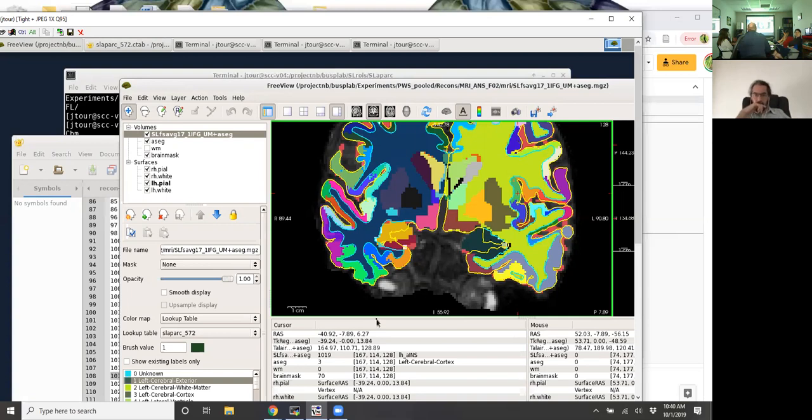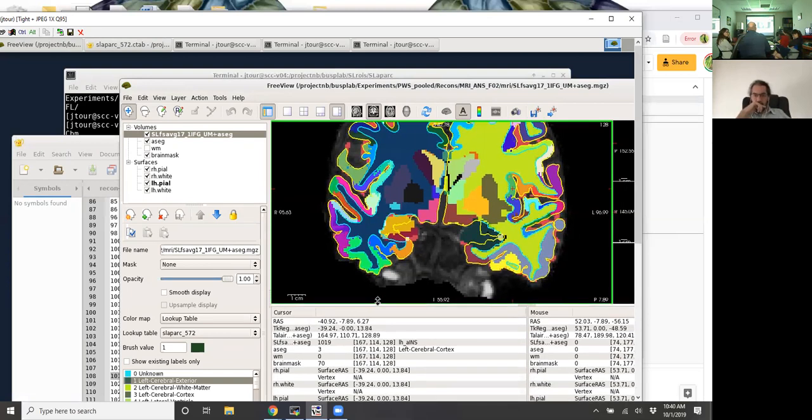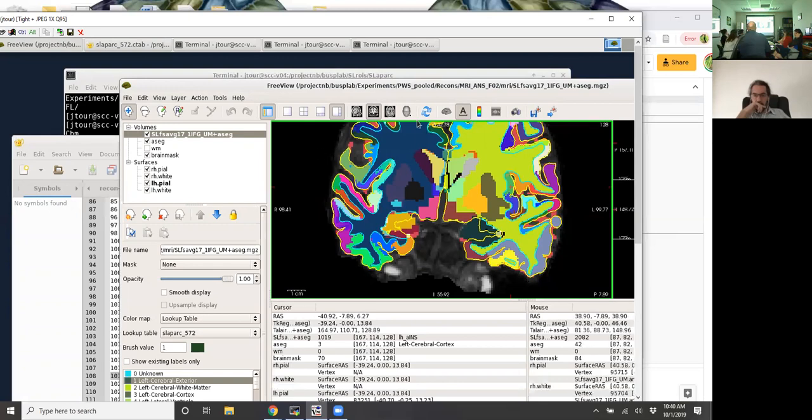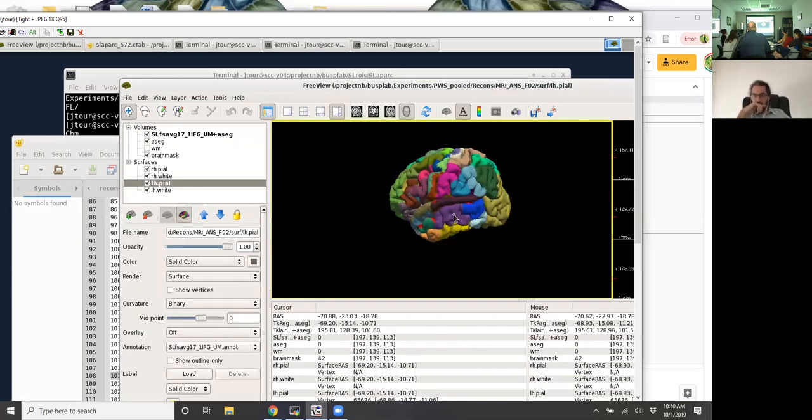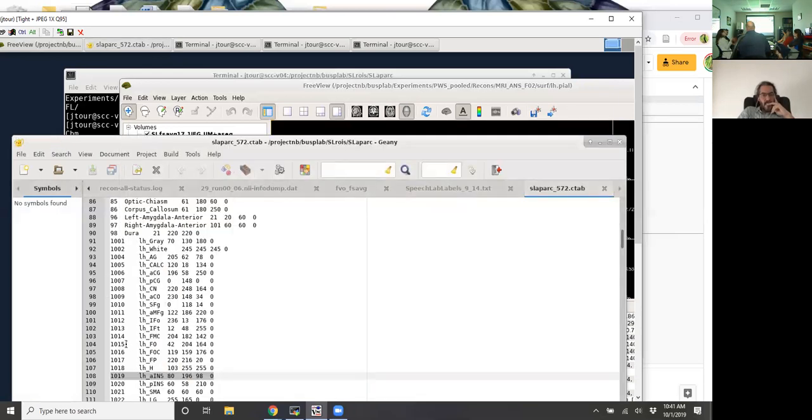And so having looked at this, I do think that this is probably these down here. So if I go back to this, I can't decide if I think that. I don't think that's actually the color value here, which is unfortunate. I wish we could see that. The indices are real in the volume, but not on the surface. That column of indices is real in the volume. Okay. In the recon, it's not used. It's not used in terms of what the actual labels are.